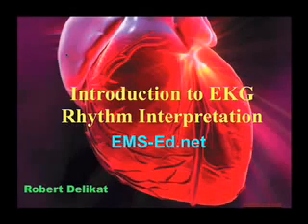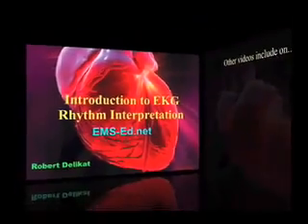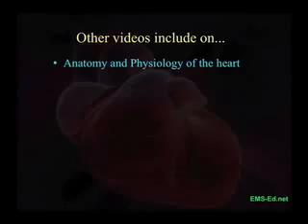This video assumes a little background in EKG interpretive knowledge, but not too much. We'll take you through some of the many basics, but mostly this is a video on rhythm recognition. If we wish to more fully understand what is going on in an EKG, we must have an understanding of anatomy and physiology, especially the heart's electrical system. We cover that in another video.